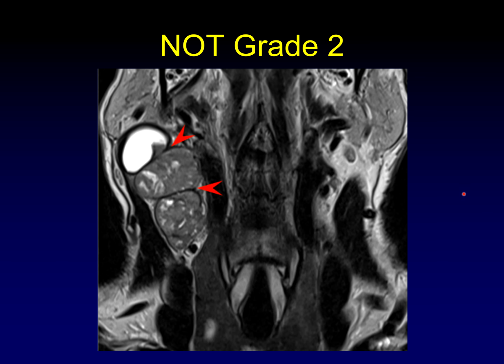Here's an example on MRI where you can see these three nodes stacked on top of each other. Have they lost the fat plane between? Absolutely. Have they lost their convexity? Yes. There's a straight line there. It's no longer convex where the nodes meet. What about the angles? There's still preserved acute angles between these nodes, so this is not coalescent lymphadenopathy.